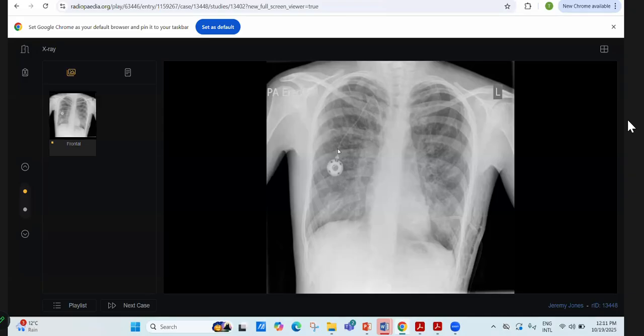Okay, what is this? This is a central catheter for chemotherapy. Okay, what is the name of this? Portacath. Okay, so considering, as you mentioned, that you think there is some disease, do you reach any differential for this? Patient is young and having multiple recurrent chest infections.